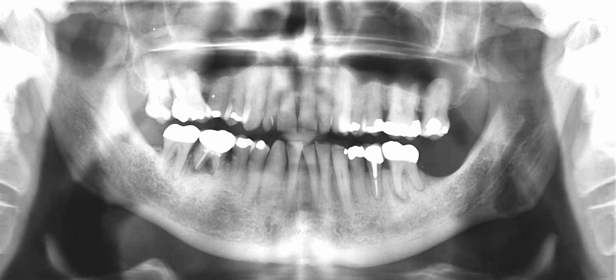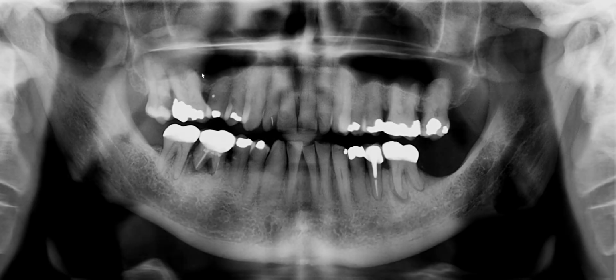Let me see if I can adjust the contrast to bring out the anterior border of this entity. So there it is. Despite the fact that we see a large carious lesion on this molar, she did say that the patient is asymptomatic on the teeth, also with no signs of sinusitis or sinus-related symptoms. I think I've shared a couple of videos in the past including these findings.